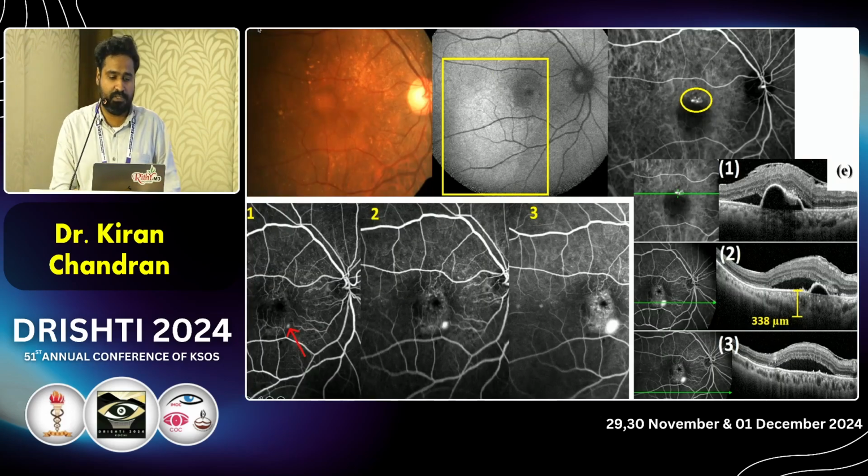So this is a case which shows defects involving the retinal pigment epithelium at the macula. On fundus fluorescein angiography, you get an ink blot leak. ICGA demonstrates hyperfluorescent nodular lesions, which signifies the presence of polyps in this area. So you've got a coexistent polypoidal choroidal vasculopathy like picture with CSCR, and this is confirmed using an OCT scan where you get a typical notched PED corresponding to the polyp with adjoining subretinal fluid as well.